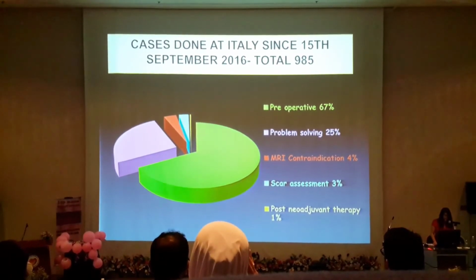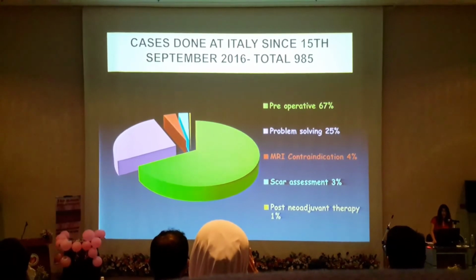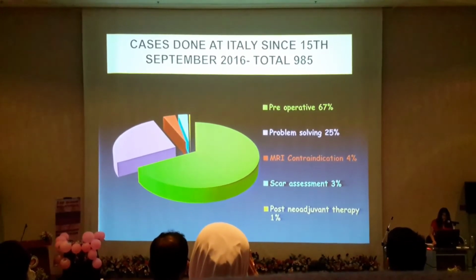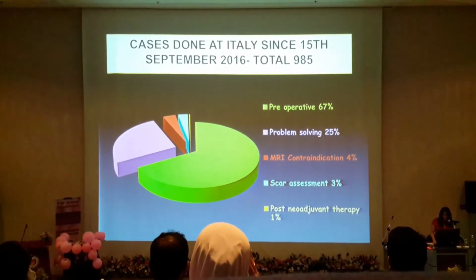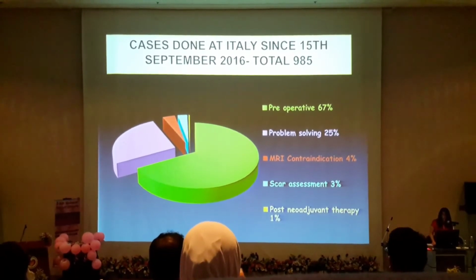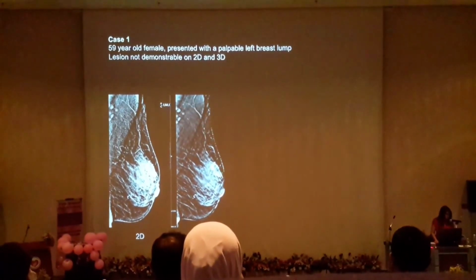Like I said, most of the cases we've done, like when I was in Italy, by the time I left, they've done about 985, 67% of the cases were preoperative staging. The rest were 25% problem solving, and the rest of them was MRI contraindication, but a very small percentage for scar assessment and post-neoadjuvant chemotherapy. So I'm just going to go over some cases. So this is case 1.